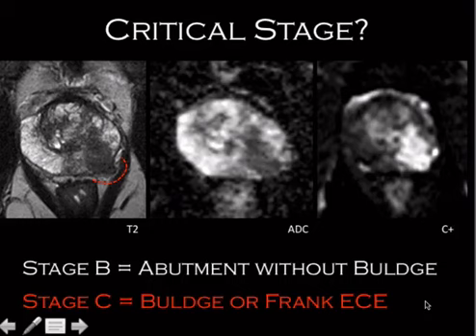And that's one of the things that you're supposed to look for when you interpret prostate MR. The other thing would be, in a really big bad cancer, the neurovascular bundle sits sort of at the corner, right around where this cancer is actually, and that can be invaded by an extended cancer. You could comment on that. The seminal vesicles can be invaded. You could comment on that too.